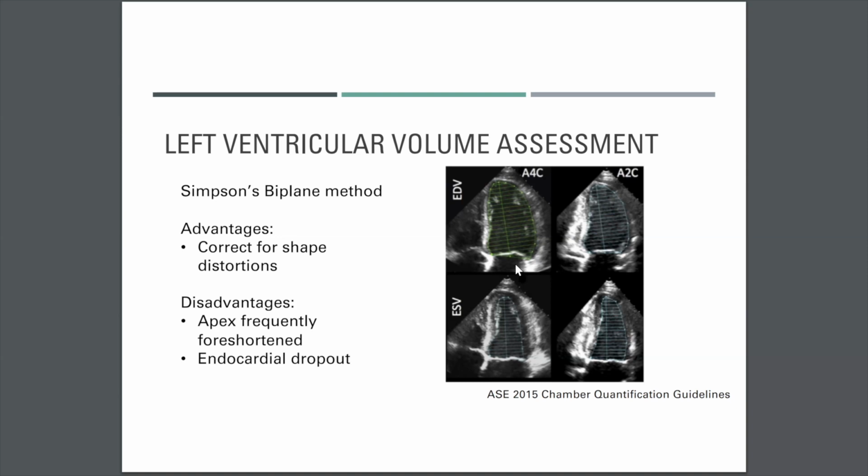That's why when you sometimes do the 2-chamber EF and the 4-chamber EF, your overall result is actually not a direct average of the two results. So that's something to keep in mind for your junior trainees in the room.